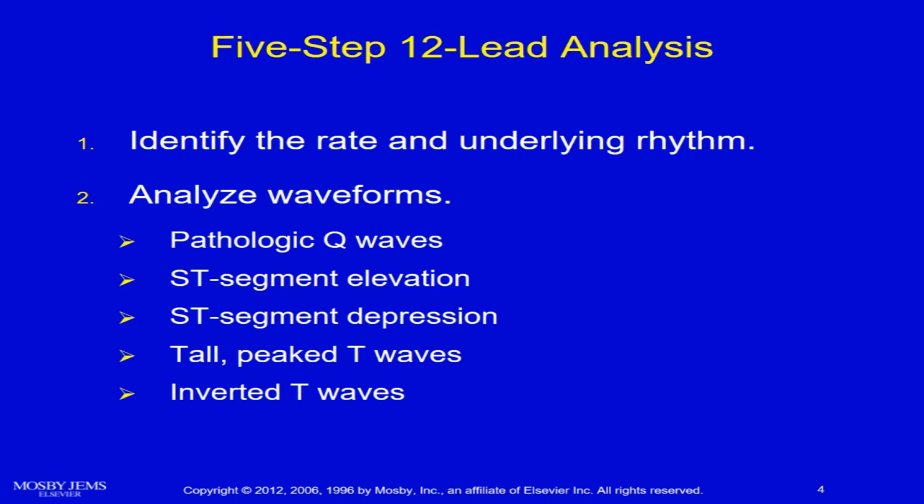Then we're looking for ST segment elevation. I told you how to do that. We got the QRS where you quit measuring the QRS. That's the point that we're looking for the ST segment. We also call it the J point. We'll look at a few of those.